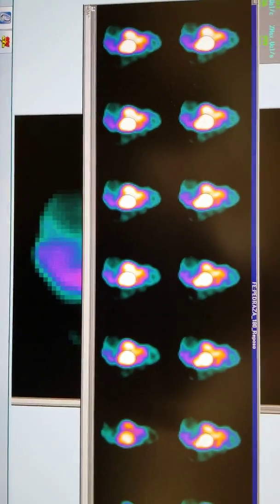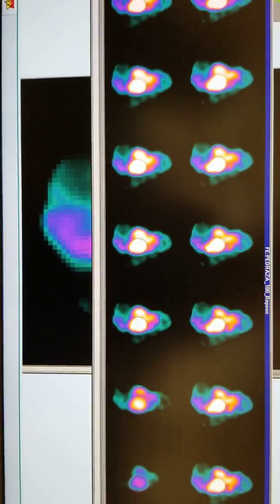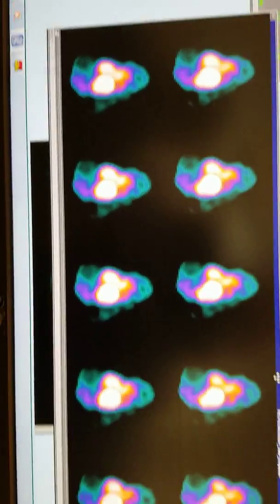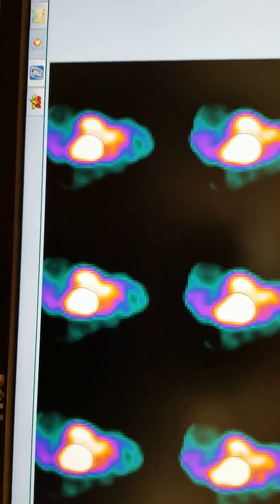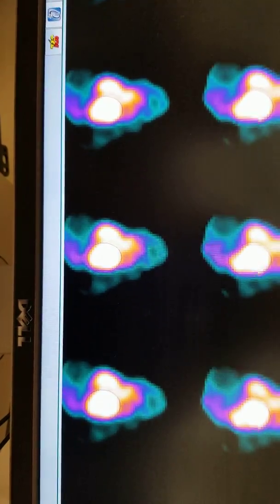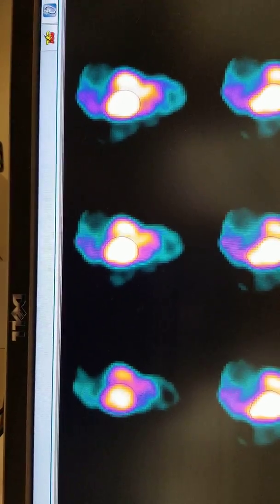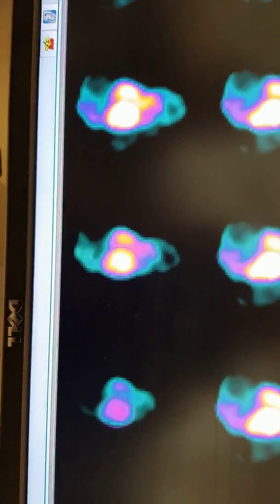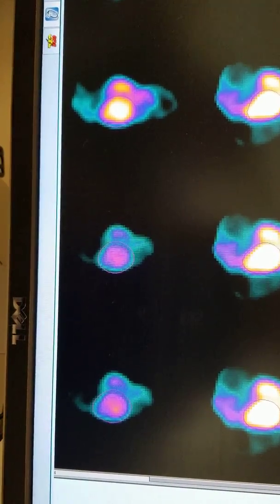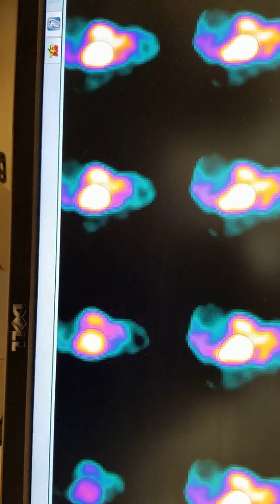Because again, on my software, the changes won't cross over to all of them because it's ghetto. But once you're happy with the brightness, now you can go in to each and every one. There's some slight areas that you can correct, but again, you've only got 22 minutes and you have 2 other studies to process. So you cannot spend all day being anal retentive and perfect. Remember, in clinic, you're going to have much better software. You're not going to have these issues. You're going to get your ROIs and you're going to move on with your life.